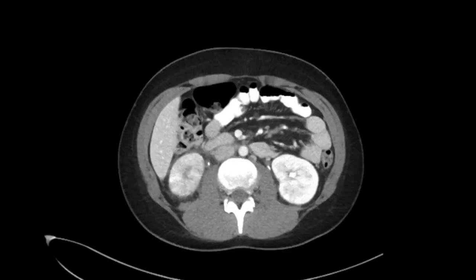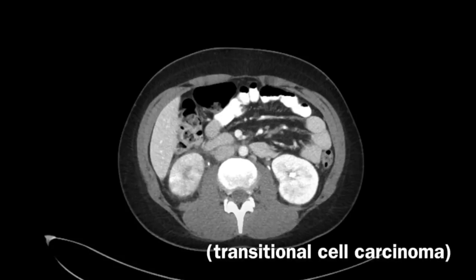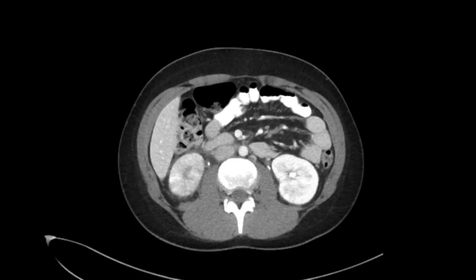Some of the reasons to perform delayed phased imaging, or imaging where you fill the collecting system with contrast, include looking for cancer of the collecting system. For example, if the patient has a history of TCC and you're looking for a recurrence, or if you're looking for injury to the collecting system, like in a trauma, or say a gynecologist may be worried that they may have nicked a ureter. If we fill the collecting system with contrast and the contrast ends up outside of the ureter, then that's obviously abnormal.